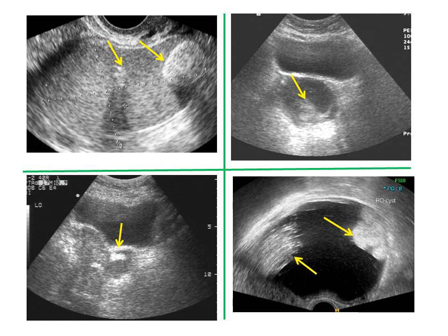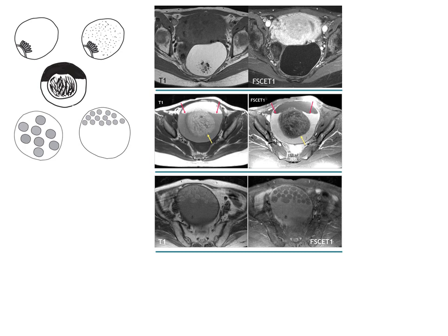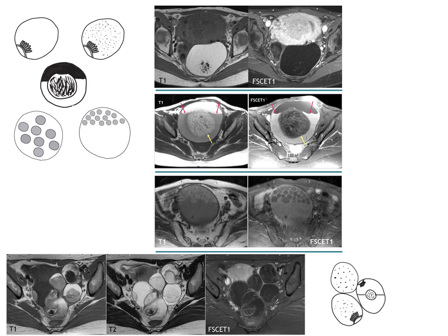the mass. Here are 3 different cases of mature cystic teratoma showing interesting findings of dermoid plaque, entangled hair floating at fluid level, and multiple floating fat balls. This is a case of large mature cystic teratoma composed of multiple cystic masses of various imaging patterns.